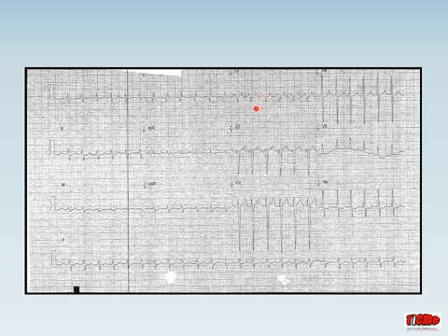So now we start seeing something that looks like a P wave and looks like a T wave. Now, really important to decide whether these are discrete different waves or whether they're the same. If you look at the tops of the waves here, you'll find that they look absolutely exactly the same. The other thing you'll notice is that the rate of these blips is identical. So there is very regular space between each of these blips. Then we're going to look at the rate, and the rate is approximately one blip every large square.